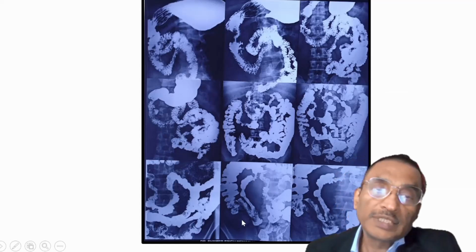So this is slightly more difficult, but this is exactly what we saw in the CT scan. So you are seeing ileum, and then you have a cecum which is well distended, and there is narrowing at the ileocecal junction. So ileocecal strictures and ileum which appears to be very irregular. Okay, so these are irregular and spiculated because of the ulceration.